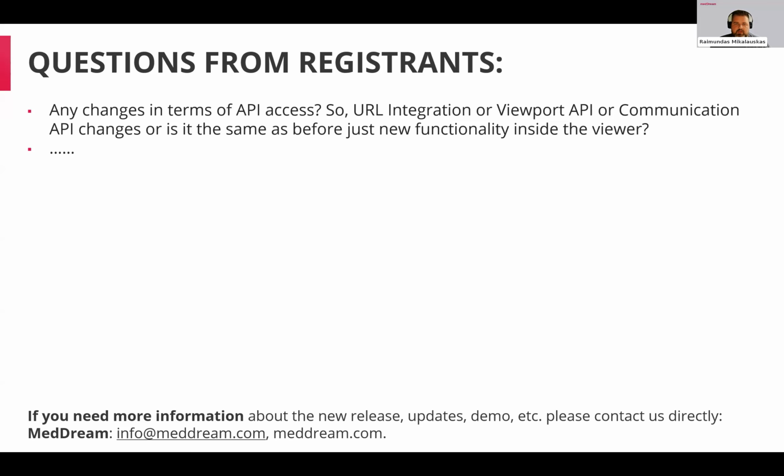So, for example, web panel was expanded to do some segmentation things, so that users from the system can set that the user needs to segment 5 fingers or livers or whatever we want, and the user knows that he needs to segment 3 or 5 or 10 segments. It has names and even colors, so it's easier for future analysis that it always remains in the same color, the same name, and to do analysis for perhaps AI tools.